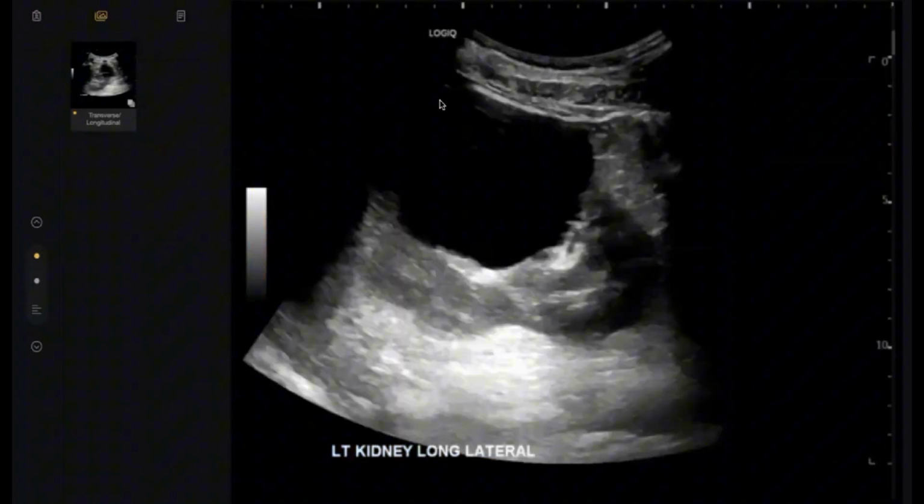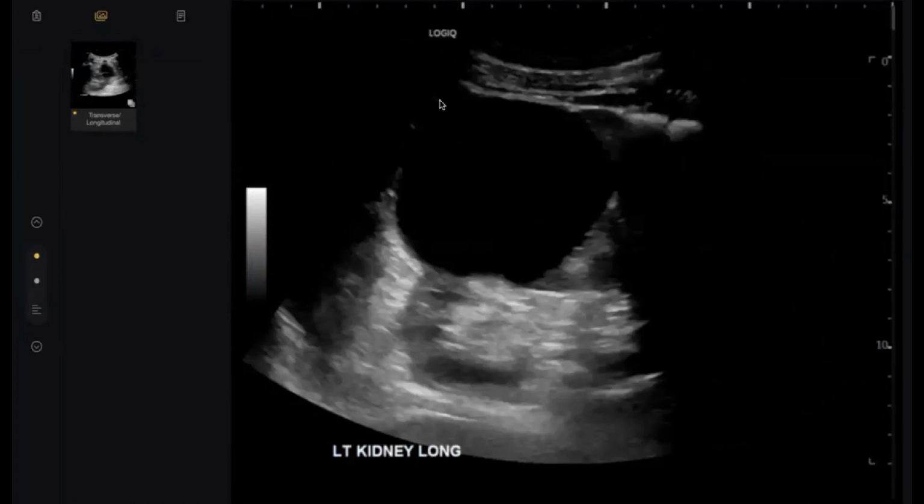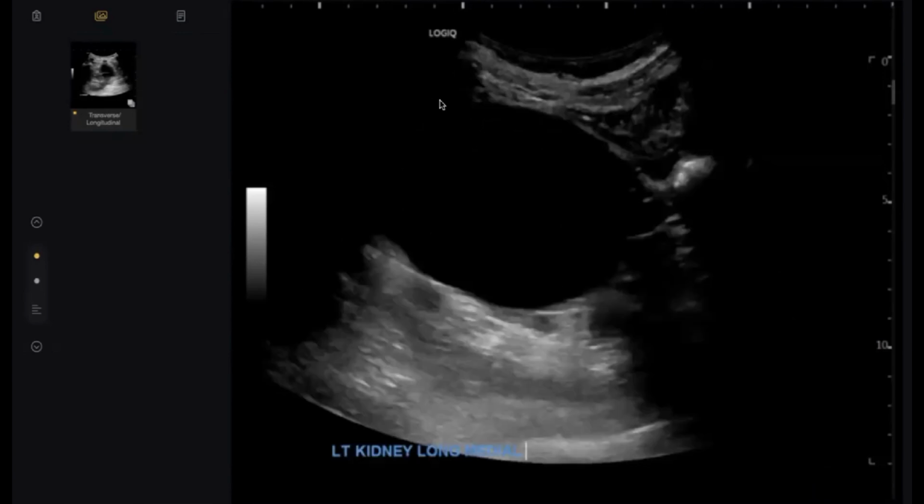I am provided with multiple ultrasound images of the kidney and the lower pelvis. In the left kidney, I can appreciate a well circumscribed large cyst in the mid pole protruding out of the renal cortex containing clear fluid. No further solid mass is appreciable on this image, and no solid nodularity or calcification within the wall of the cyst. This is causing compression over the mid-lower pole calyces, but no associated hydronephrosis is noted. I would like to see the rest of the images.